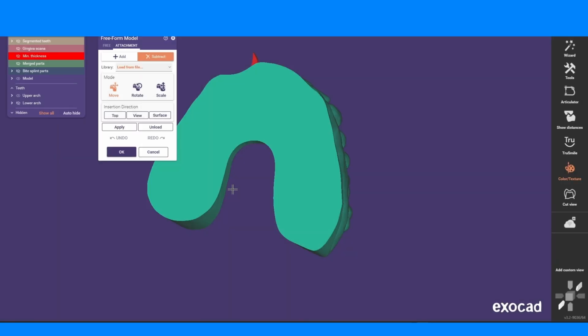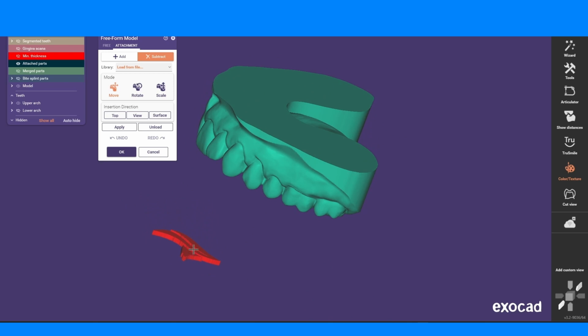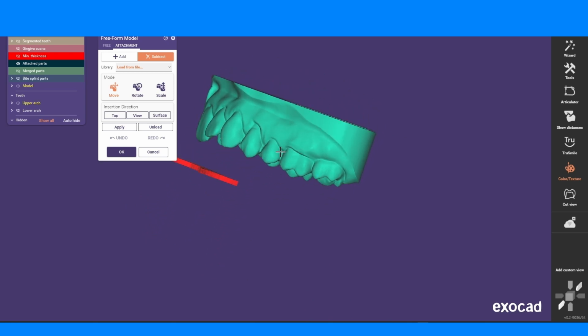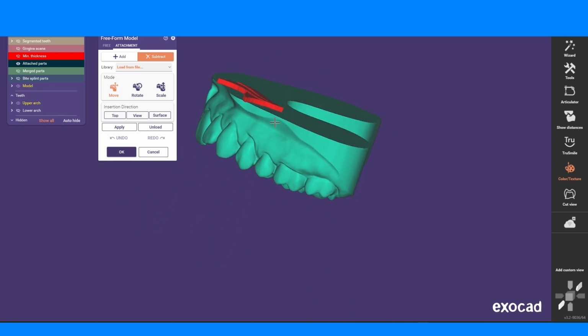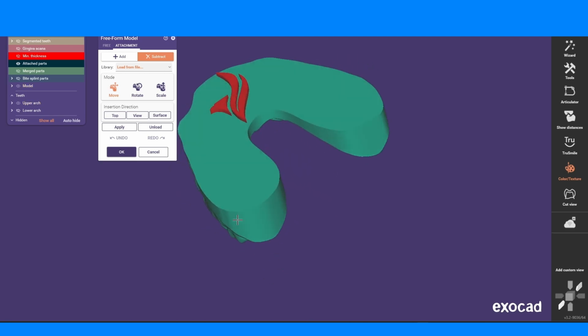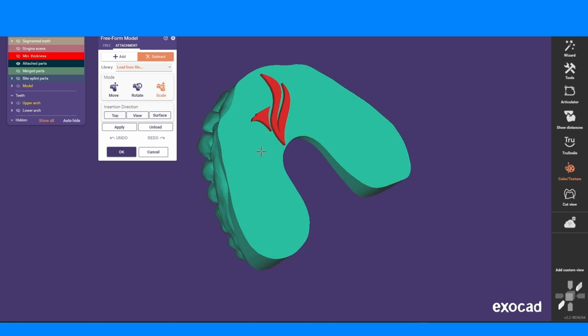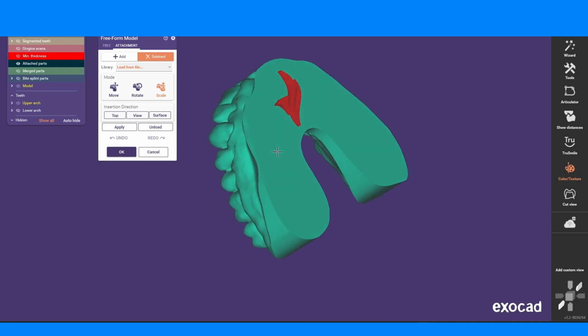You can choose rotate. It's more of an alignment with the model. And then you get to move your logo, which is the object technically, to where you need it to be. If you need to adjust the size of it, you can use the scale option and hold down the control button to scale it down or up. Should be the right size.